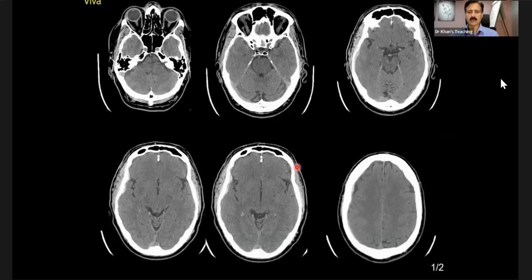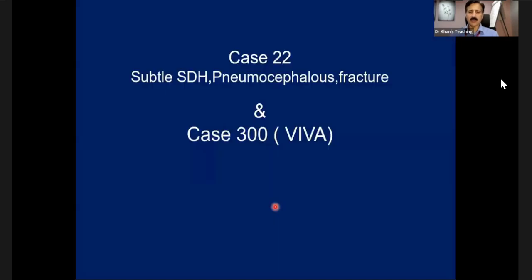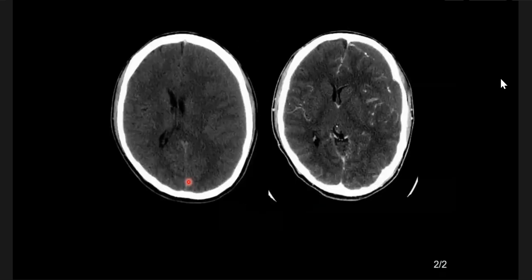Any hematoma here? Yeah, again in the middle cranial fossa, I can see a fine right-sided subdural. And do you agree that it is better visible? Okay. Any hematoma? I think there is a hematoma along the left convexity. Actually, it might be because they're so isointense and there's no midline shift. Could it be bilateral hematomas? But there's definitely something along the left convexity I can mildly appreciate.